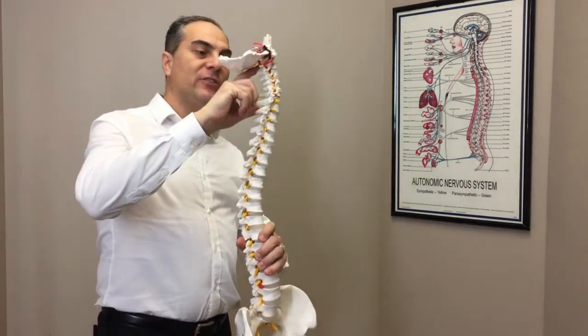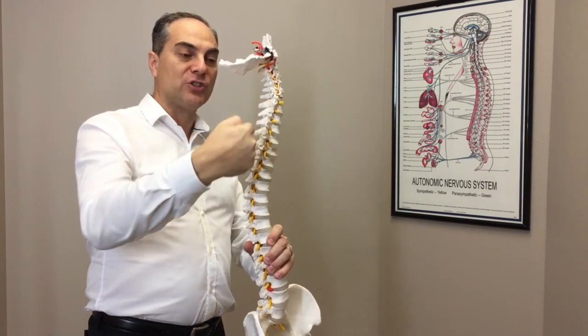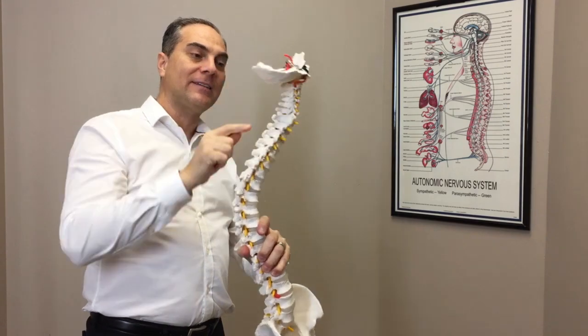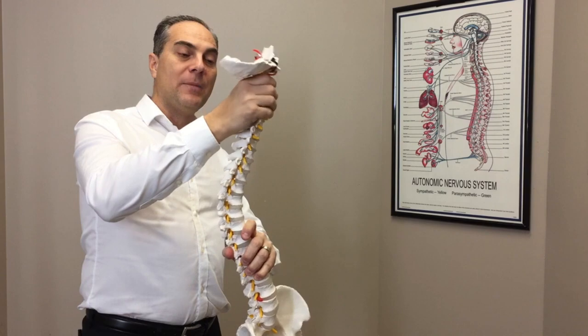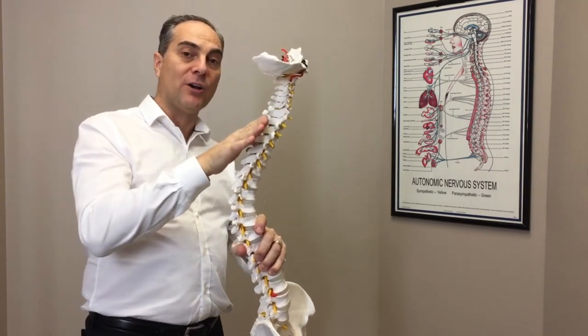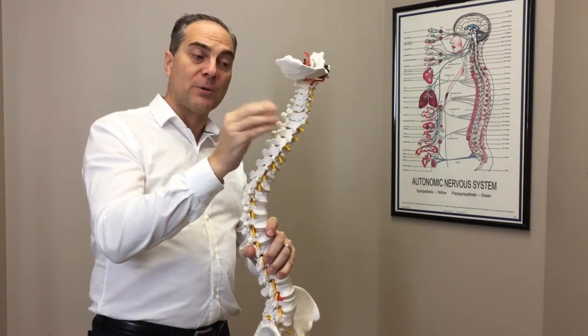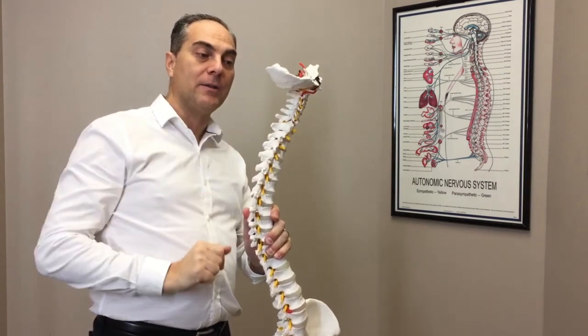So we look at the spine. Here's the neck position. The head sits here. This part of the spine should be around where the shoulder is, right about here. When this goes forward, you'll see that the neck is actually driving forward over here. And that can also flatten out the spine. It could also round up the upper part, causing that neck hump that's commonly referred to as a dowager's hump, or upper back hump over here. So that's what a forward head posture looks like on the spine.